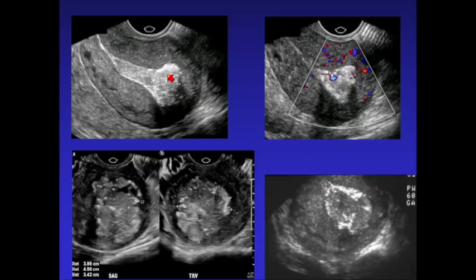And here we can see this is some calcified material within the endometrial cavity extending into the myometrium. But the further it extends into the myometrium, the more likely it is that you're going to suggest that there's placenta accreta. And here you can see the myometrium's very, very thin. And this would not be a normal placenta. This is an invasive placenta.